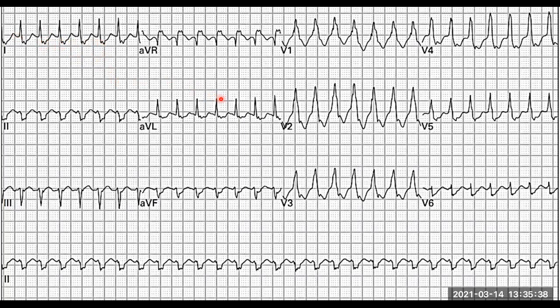And if you're faced with this immediately, now you may start wondering, all right, should I look for ischemia? Should I not look for ischemia? It actually becomes very difficult to look for ischemia in these types of patients simply because of the morphology of the QRS complex. So ischemia is very possible, and you can get ischemic changes. You can see changes in the ST segment, but in order to find changes in the ST segment, you have to be able to identify the ST segment. So the question is, what's going on?